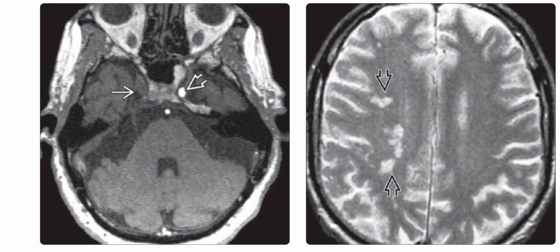So the left image is the axial MRA, and it shows a lack of flow in the right cavernous ICA. Also noted is the normal flow related enhancement of the left cavernous ICA. Right image is the axial T2 weighted MRI in the same patient, and it shows a vertical line of white matter hyperintensities. These lesions form a rosary-like pattern and are along the deep white matter watershed zone, where the cortical penetrating arteries meet the deep perforating arteries from the circle of Willis. They should alert the radiologist to the possibility of a flow-limiting lesion, often related to the carotid ASVD.